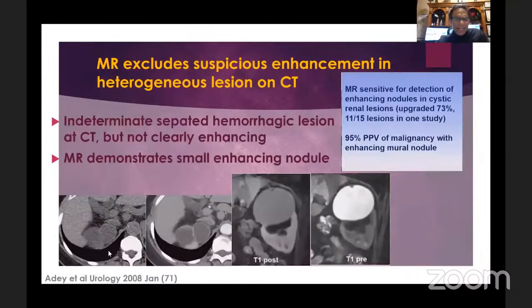This was an indeterminate lesion, as it was kind of bilobed or trilobed, and we can see following administration of IV contrast some septations within it. Is there some nodularity within it? So this was at least a 2F lesion by Bosniak classification.